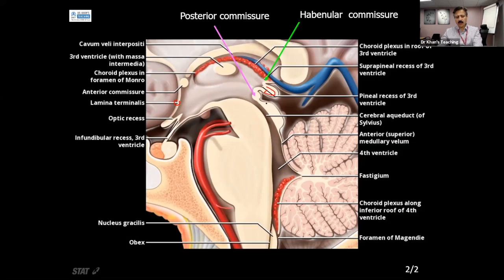Now, come to the brainstem. So please remember, we are at the midline of the brainstem. So from here to here is what we call the tegmentum, and this is the tectal plate. And if we go parasagittal, then you will see the superior colliculus and inferior colliculus, which are a paired structure, but they will be right and left. This is a midline sequence.